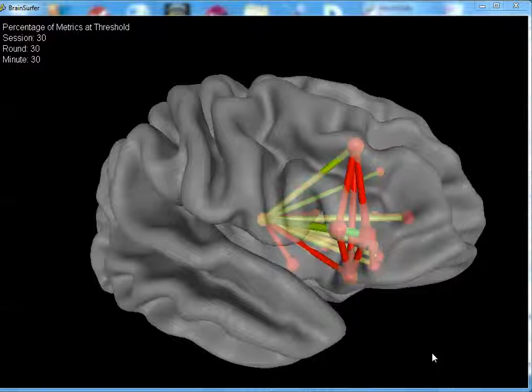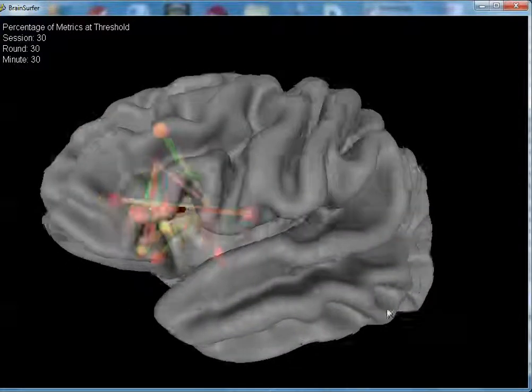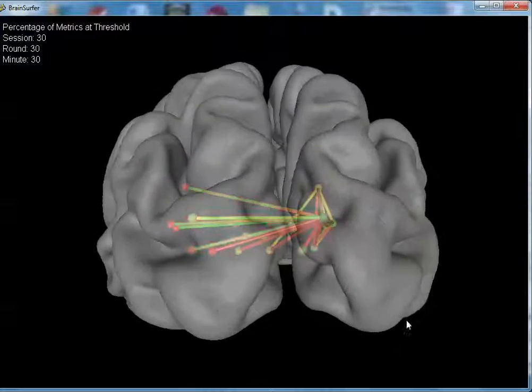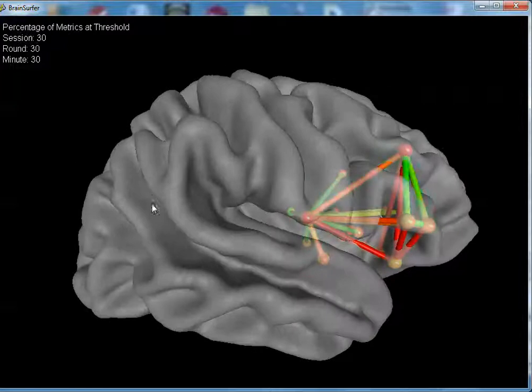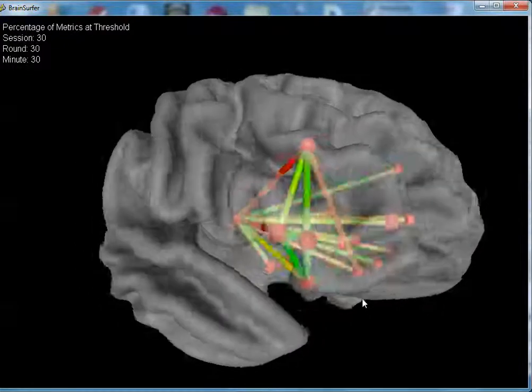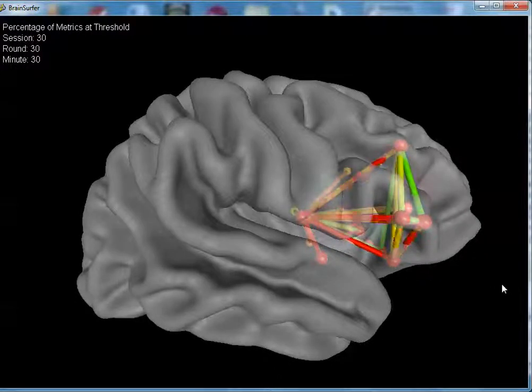This is the BrainSurfer software in which we're showing here the addiction network. The BrainSurfer software is inside of NeuroGuide. That's both an assessment acquisition software as well as treatment software in the area of biofeedback. There's a variety of different networks that one can select. You can see that I'm rotating BrainSurfer to show everybody what the addiction network looks like.